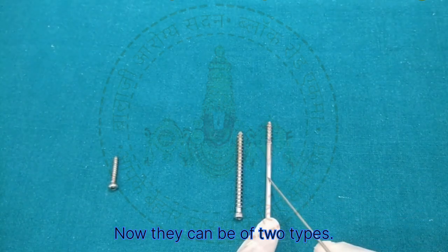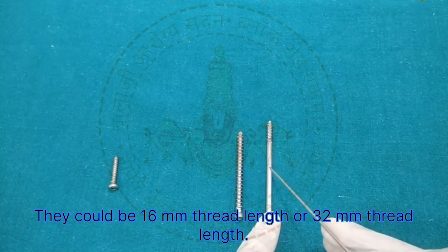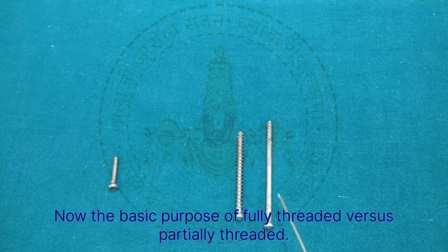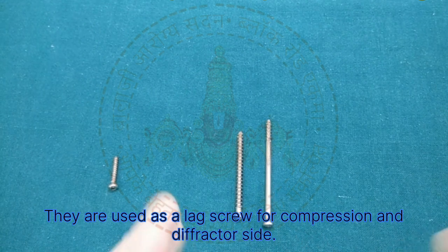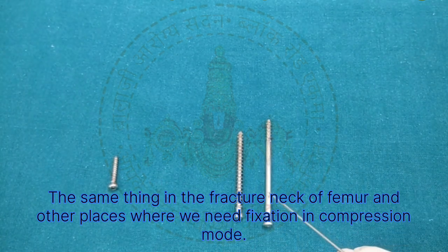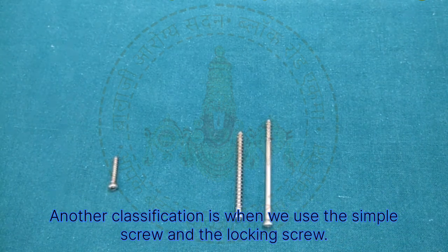Now they can be of two types: there could be a 16 mm thread length or a 32 mm thread length. The basic purpose of fully threaded versus partially threaded: the partially threaded screws are used as a lag screw for compression at the fracture site, for example in fracture neck of femur and other places where we need fixation in compression mode.